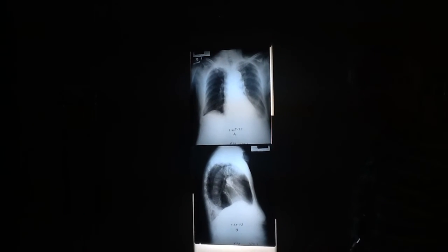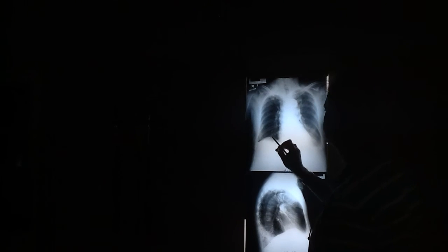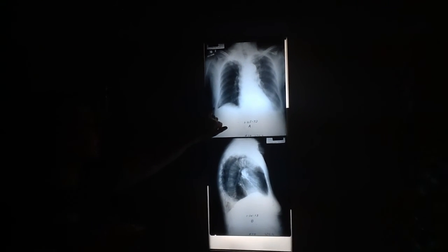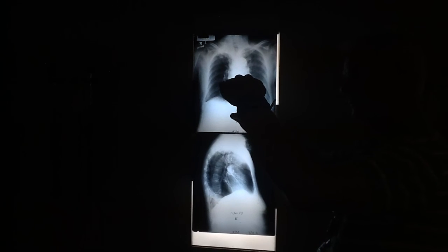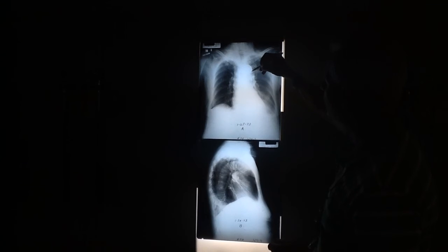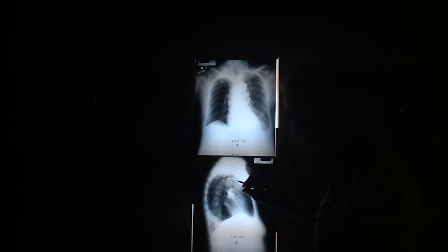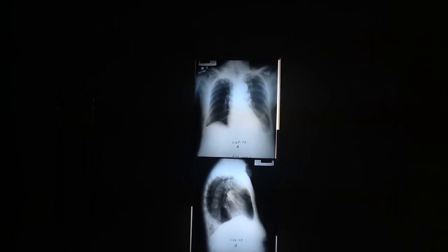How about the right lung on the base? You see two different densities. Is that the liver and the diaphragm? Right here? No, there's a little bit of eventration. This is the diaphragm. It's coming along like this. Part of it's elevated. So the beam's seeing here and it's seeing here. And I think there's probably a little bit of eventration is probably what's going on. Nice plaquing here, here, here. This was a patient with breast cancer, metastatic to the pleura.